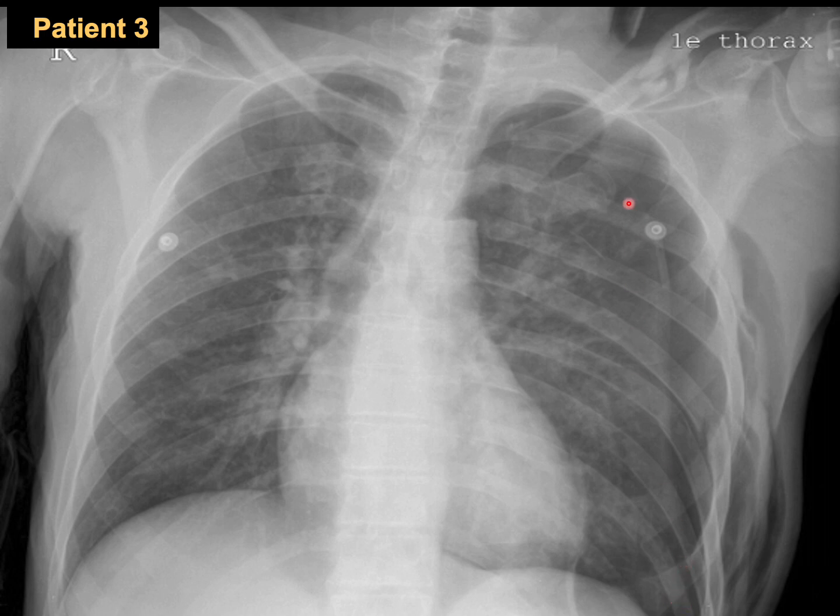So this is A, B. Go for C. C is okay. You should not be able to see the diaphragm all through, this very well demarcated like this, but you can see it here because of the pneumothorax. A, B, C, D. Bones. Clavicle here is okay. Clavicle here is fractured. This might be missed. Take care. And here what we have from the shoulder is okay. Here also.